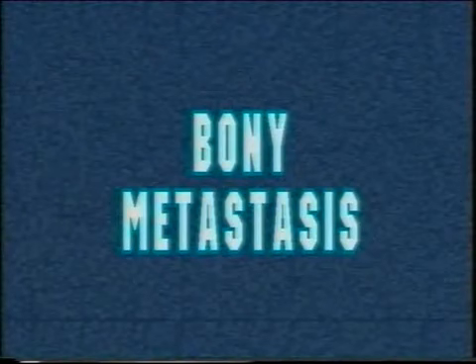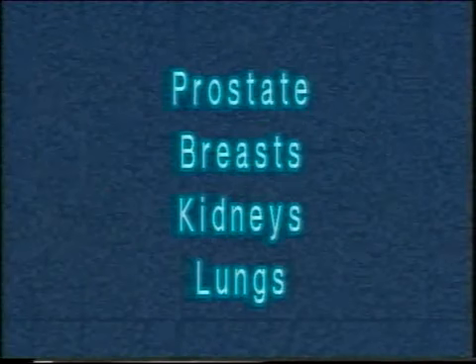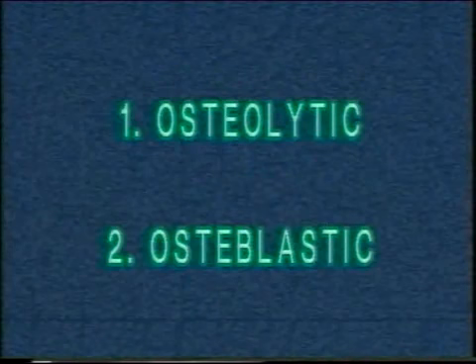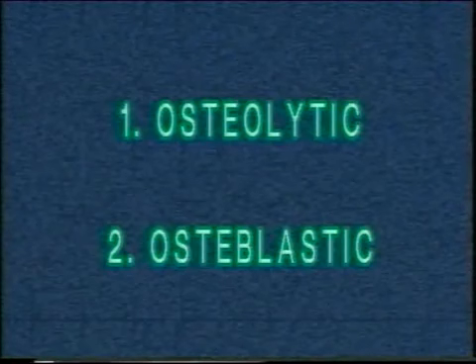Bony metastasis. All malignant tumors may spread via the blood to the bones and develop bony metastasis, the commonest being from the prostate, breast, kidneys and lungs. The bony metastases are of two types. Majority are osteolytic, destroying the bone, and some are osteoblastic, forming dense new bone.